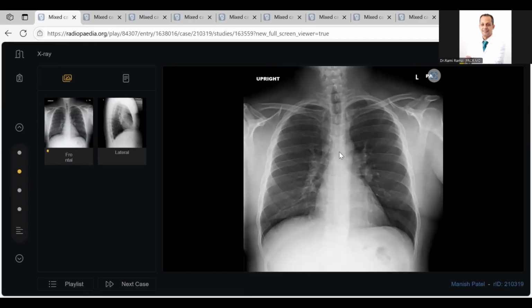Okay, sir, this is the chest X-ray, frontal projection. I can appreciate there is a left hilar prominence as well as a prominent right paratracheal stripe, which seems to be lymphadenopathy, hilar as well as paratracheal in location, and some reticulation in the parahilar region in both mid zones.